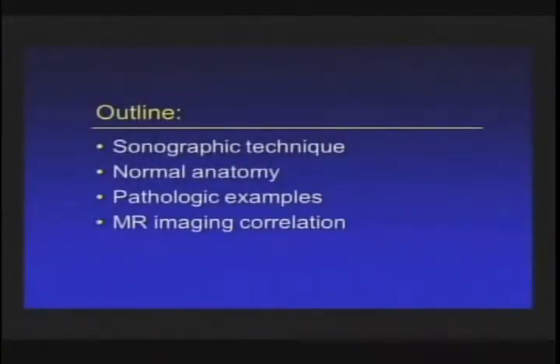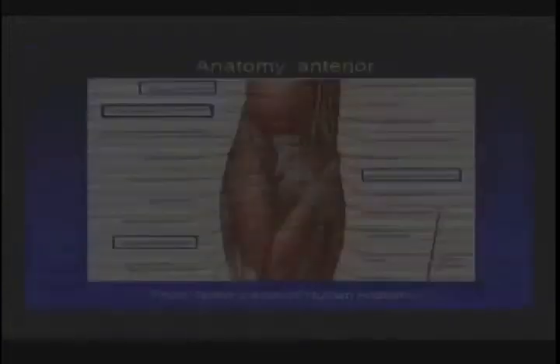So we've talked about the sonographic techniques. I'm going to briefly go through it again, just very quickly, because a little redundancy I think is good. Then we're going to move on to the pathologic examples.